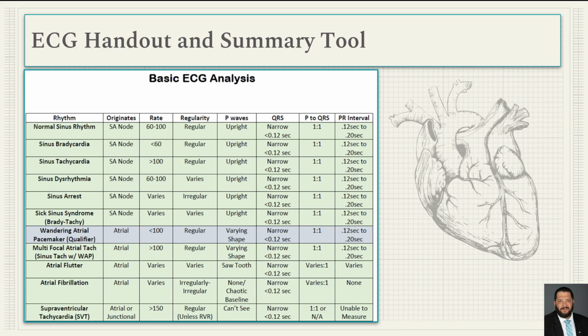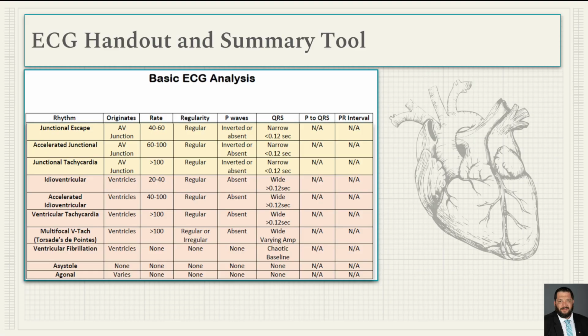And practice, practice, practice. I've said it before throughout the series, and I'll say it again, that rhythm interpretation is as much of an art as it is science. These tables on the screen here will help get you the science piece that you need. But the art comes with practice.